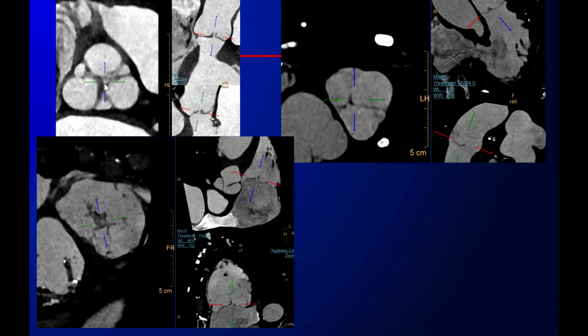You know, we see a little small, I call it a gap, a non-coaptation gap in CT that would technically correspond to the anatomical regurgitation orifice. If you measure this, this is probably what the vena contracta diameter we see, and you can measure the diameter and the area of the non-coaptation.